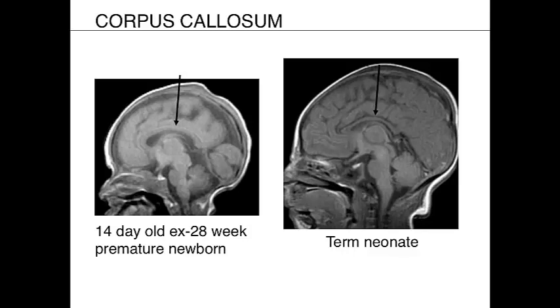And in the neonate, we have here a corrected 30-week gestational age neonate on your left and a term neonate on your right. We oftentimes will use T1 weighted images since we tend to acquire 3D gradient T1 volumetric images, and we can see that it's isointense to the unmyelinated supratentorial white matter.